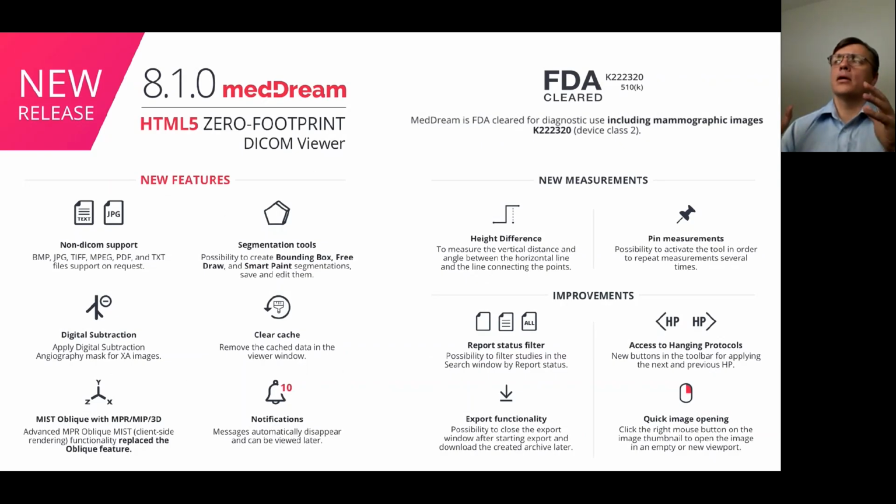So what are the most visible new things in our new product? Later in our presentation, I hope to show these major features for you on my installation. But let's go, and I will try to explain all the functions briefly.